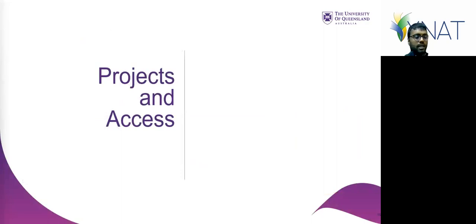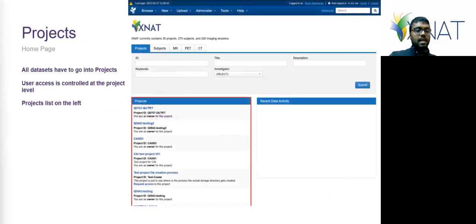So we'll now look at XNAT projects. Projects are the core of XNAT. When you log in, you'll have a list of projects that you have access to. Remember, when you log in for the first time, you'll usually not have access to any projects because your user account would have just been created. So the facility will have to add you to your project. All data sets have to go into projects. User access is controlled at the project level, and there'll be a project list on the left.